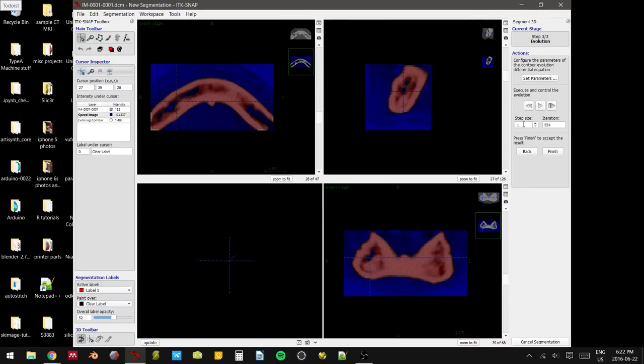Your step size is basically going to determine your iteration. Your iteration is how many growth iterations. That's a bad definition. The iterations basically say how many moves of growth your bubbles have taken to fill up your object. Your step size, I'm pretty sure anyway, increases the speed at which it does this, but it's sort of taxing on my system with a limited amount of RAM.